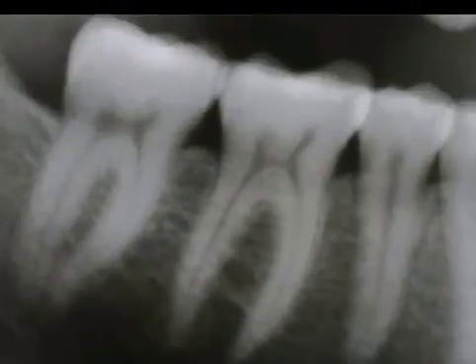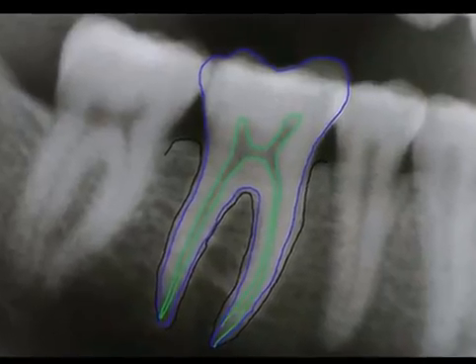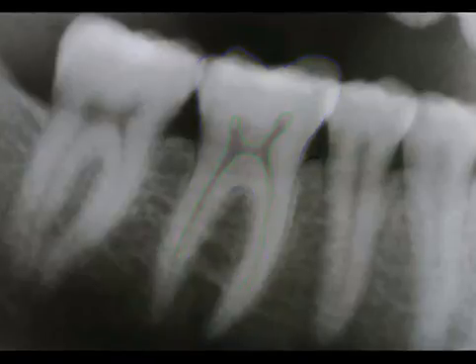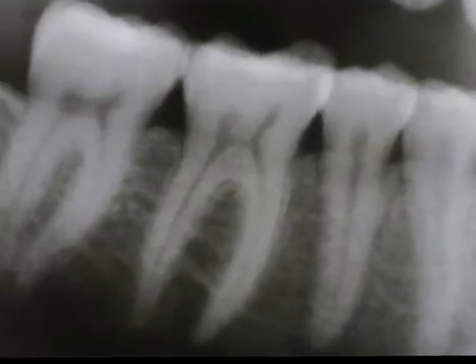You can recognize the teeth, shown here in blue, which are separated from the bone, shown here in black, by a very fine gap, the periodontal gap. The tooth also shows dark shadows, shown here in green. Here there is less dentine, which is why the picture goes dark. This is the dental nerve.